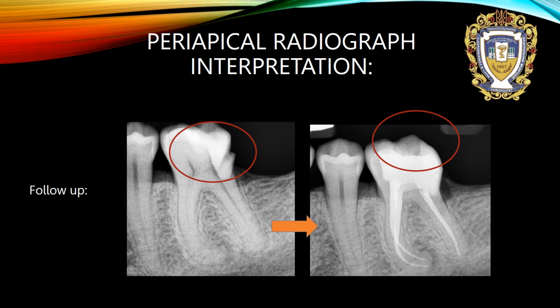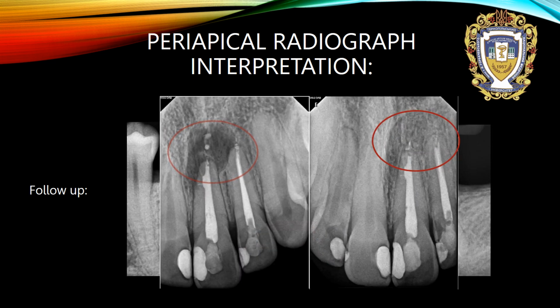Next purpose of periapical radiograph in X-rays is follow-up. We can observe the treatment process before root canal treatment and after root canal treatment, or results of our treatment, some granulomas or cysts.